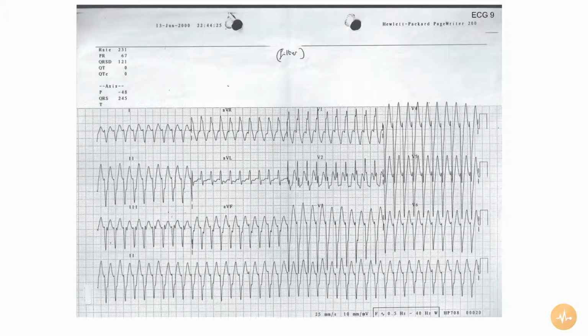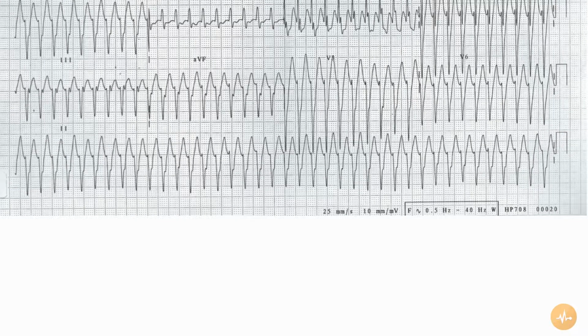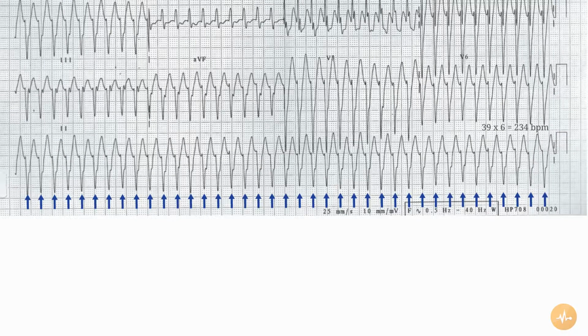This is the 12-lead ECG of a patient with sudden onset hypotension and depressed consciousness. Pause this recording now and interpret the ECG on your own before pressing play again to hear me interpret the ECG. The rate is 230 beats per minute with a broad complex.